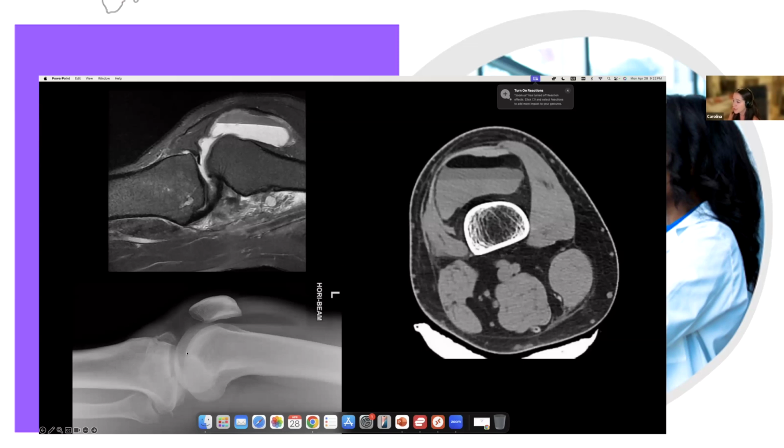And an intra-articular bone fracture, why? So you see here, there is this pretty gnarly fracture of the tibia. And whenever we have fat in this type of effusion, it means some of the bone marrow fat is escaping and is getting into this effusion.